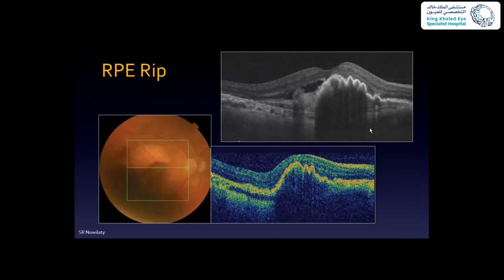Now in AMD, sometimes the RPE is elevated and so much under pressure, under stretch, that it rips. When it rips, it causes an accordion effect, basically like a door that is under stretch, and you open it, and then it becomes pleated. So here you have this RPE that is wrinkled right there, and then here you have loss of the RPE. So the whole RPE, under stretch, goes to one side. It denudes the choroid and the sclera underneath, right there.